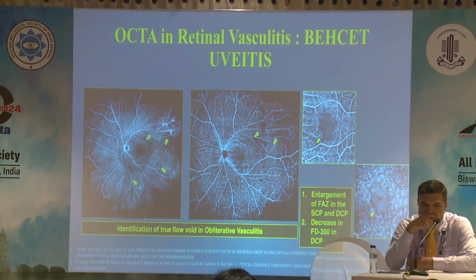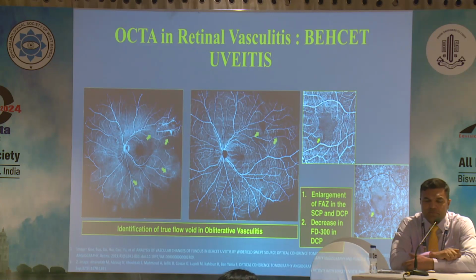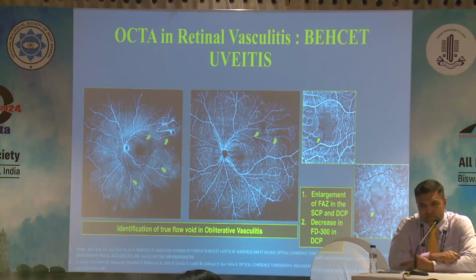So as has already been discussed, how do you see retinal vasculitis? So we always say that OCT angio doesn't show any leak. So how do we use it? So we know that FFA by its benefit shows leakage, but that leakage is limited, except in Optos. In fact, the conventional FA can work against it, because in this montage view, if you create a montage view, you don't take the scans at the same moment. So you tend to miss those CNP areas. So you do a widefield OCTA in this patient, and you can beautifully identify those CNP areas.